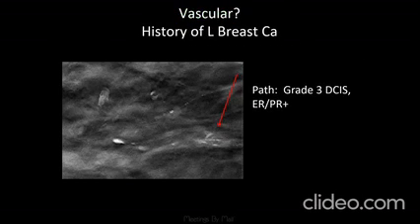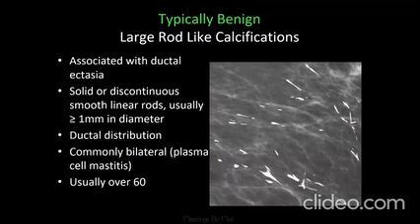And sure enough, that was grade 3, high grade DCIS, so hard to see, but high grade.